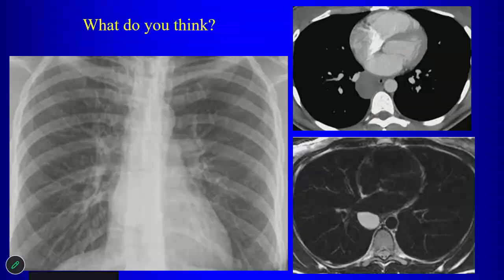Well, what do we notice on T2 MR? It is very bright, right? So do we think that's a cyst? Yes, it can be. Okay, so what kind of cyst would this be? Esophageal duplication cyst. Well, it's in that same kind of spectrum of abnormalities, but you can be a little bit more specific with this one. What would you say?